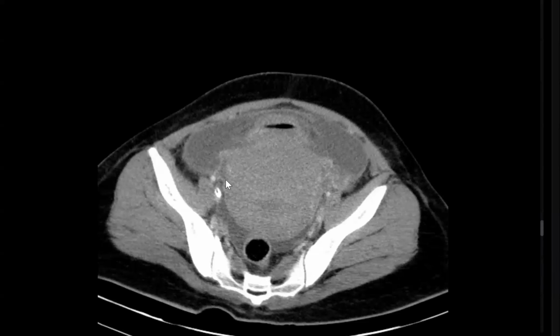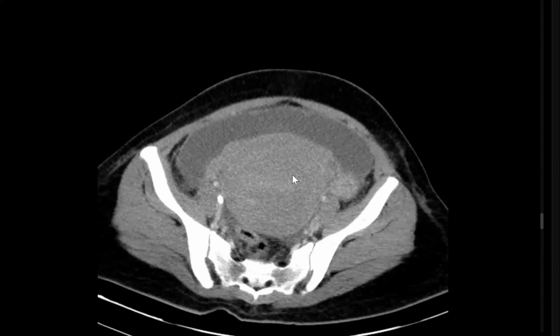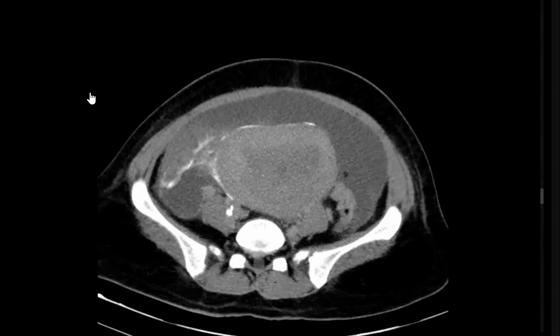No problem, you can ignore this one. So how to assess for a bladder or ureteric injury in this case? A delayed scan, or alternatively, we can empty the bladder and re-inject. Yes, I'll give you the cystography.